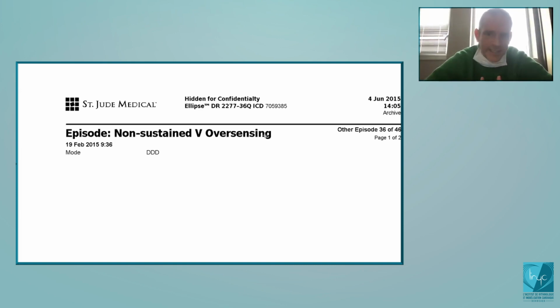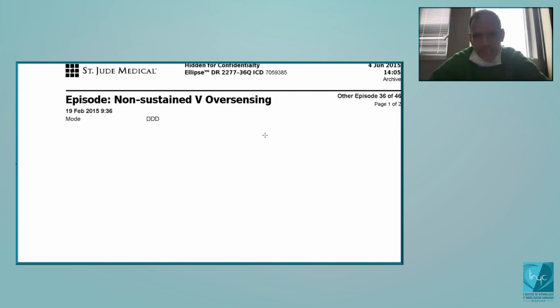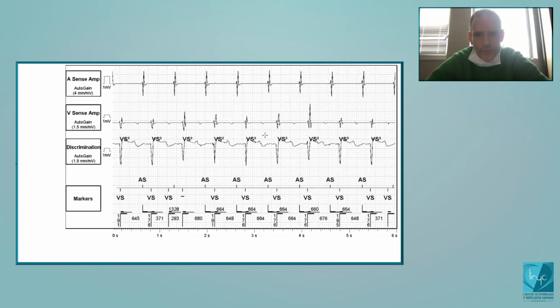to decrease the number of inappropriate therapies. Of course, in case of lead oversensing, lead noise, but also in case of, for example, T wave oversensing. So what do you think here?